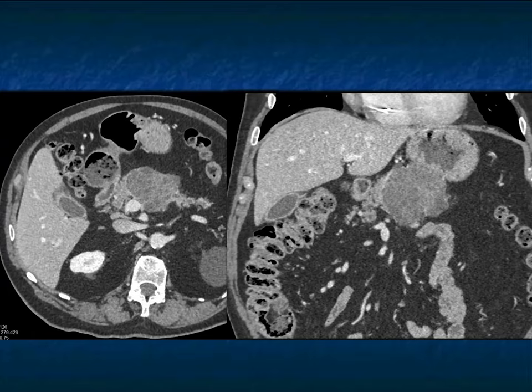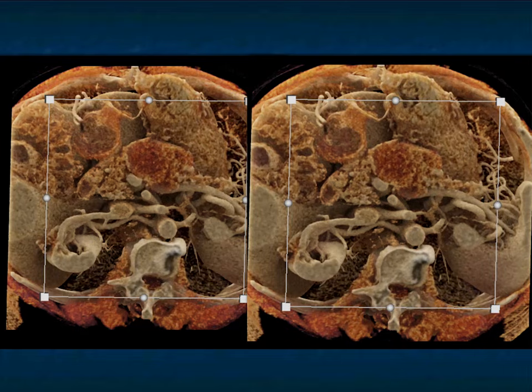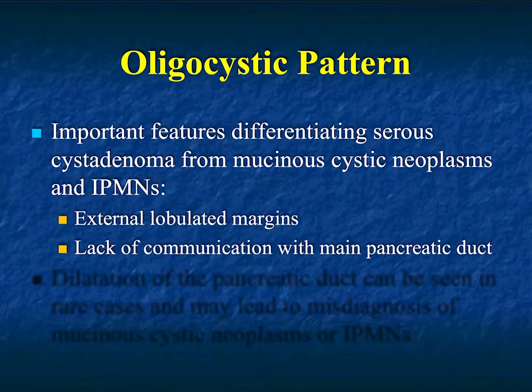You can see it better on the venous than arterial. And so you've got to be thinking about a serous cystadenoma. But I'm positive once you see the dilated duct, you'll be getting proof with EUS to make a definitive diagnosis. Here's the same case with cinematic rendering, septations a little bit better seen.